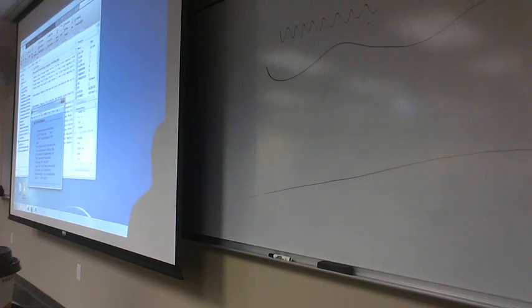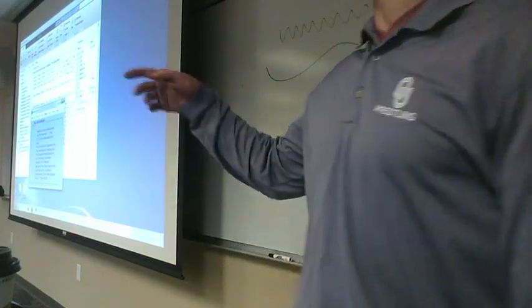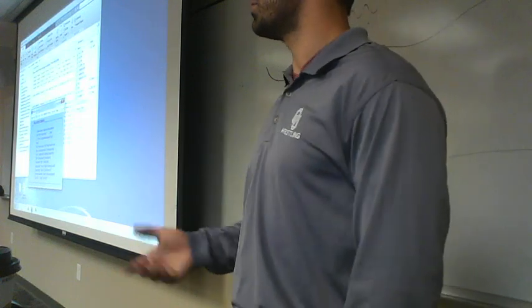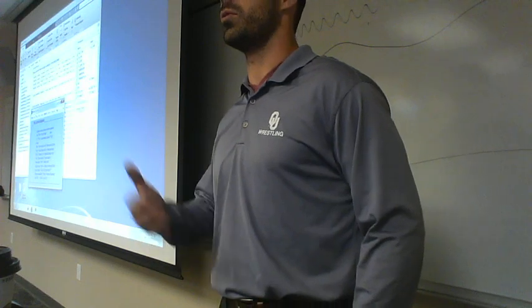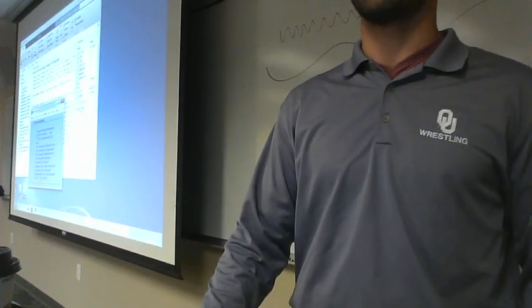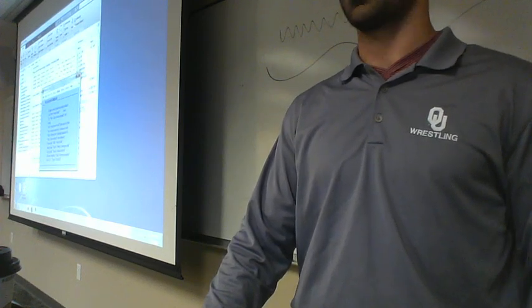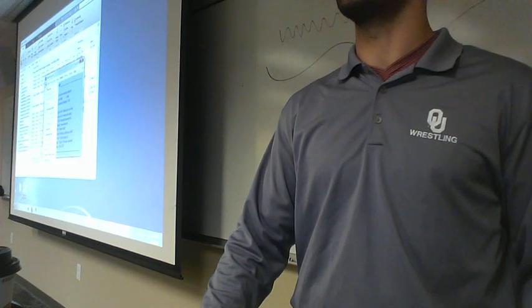Okay, so here's the thing, right? I just had to reboot for a reason. It froze up, and I needed to unfreeze the computer. So let's say that now I want to load up and I want to catch up to where you guys are at. Okay, what I do is I don't have to start from the bottom where we started at before.